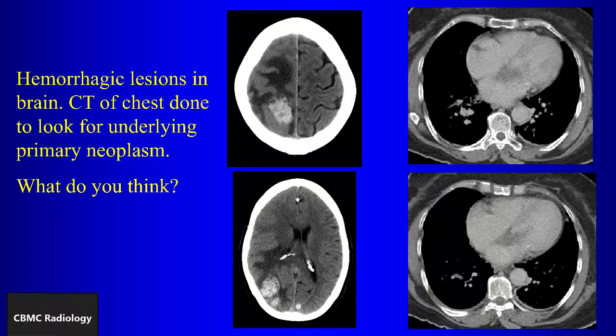You mentioned left atrial myxoma, right? So certainly. So what might we do to evaluate this further? MR, right. So what view would you like? Four chamber. Yeah, four chamber SSFP. Now imagine in your head what you're about to see on the MR.